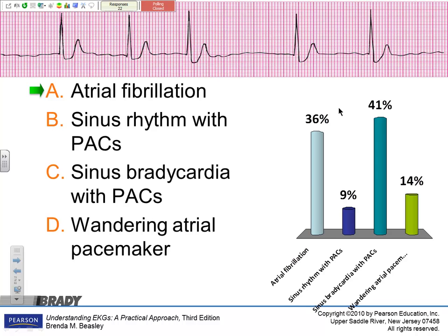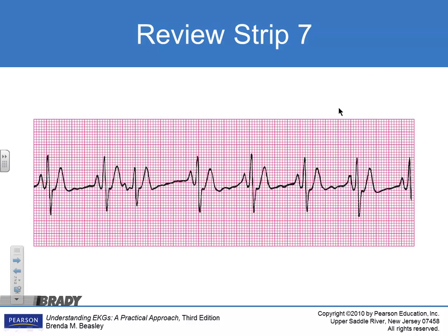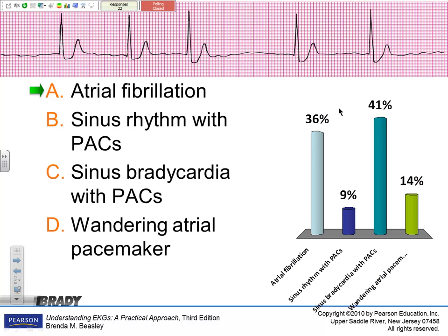If this were sinus rhythm with PACs, that means premature atrial contraction, right? These are pretty regular. Here, there's this elongation, right? So that wouldn't be a PAC unless we got 3 PACs in a row here, which we won't have.